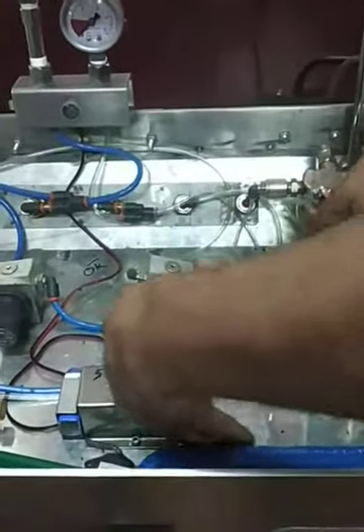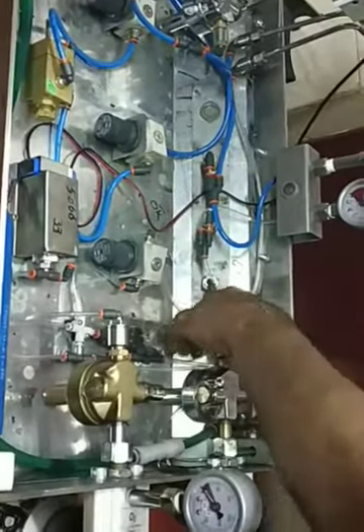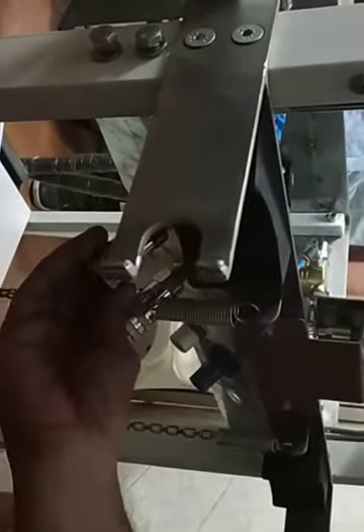Then this is going to the hypoxic alarm. See, there is a battery over here. This is the hypoxic alarm. So this is connected over here, and this is connected over here also. And there is a provision at the back of the machine, if you see carefully. This can be attached to a ventilator if we have to in future, okay.